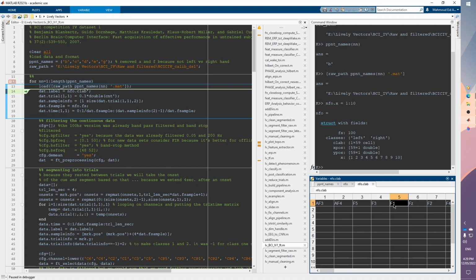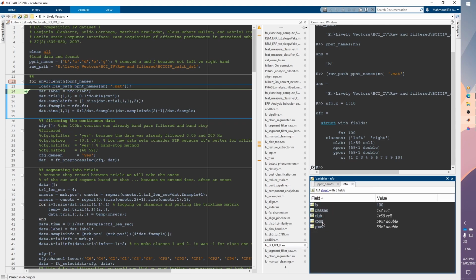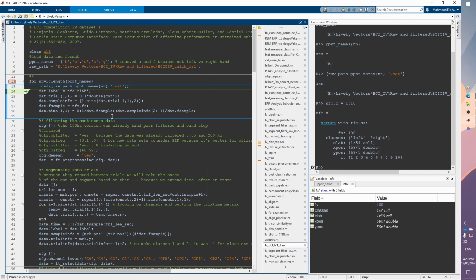So of course each one of them is placed in a different place. Like for instance, this one is a frontal electrode, and it's placed on the left side, because this value is odd. When it's even, it's the right side, and so on. So feel free to check an EEG head cap and see the places of every sensor. And I think these are the X and Y position of the electrodes. So I think that's nice.